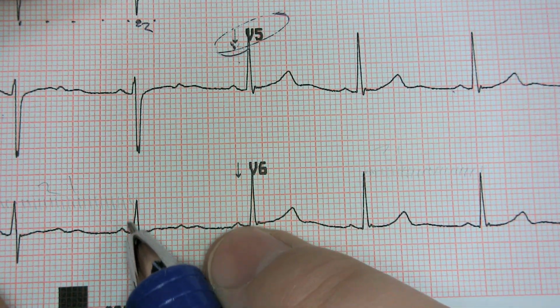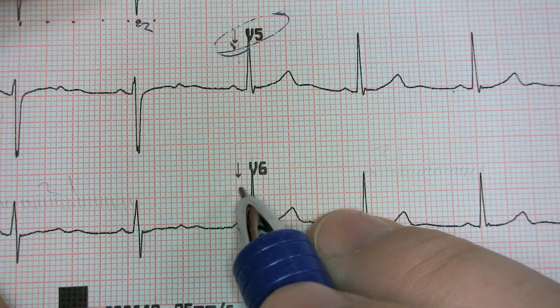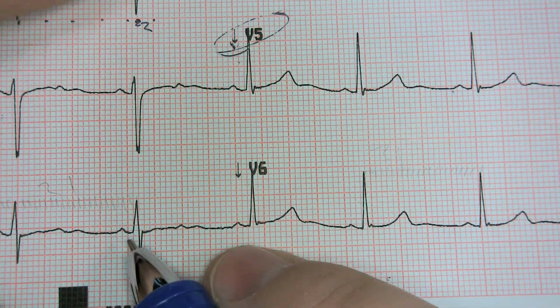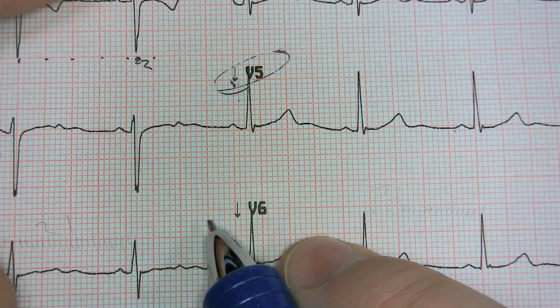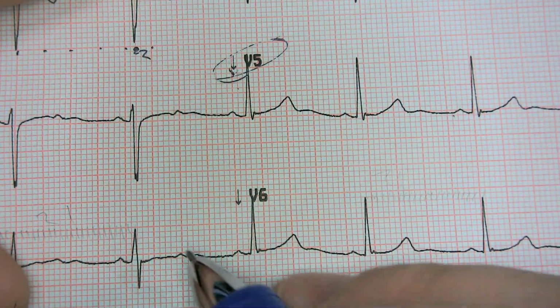This is less of a down, up. This looks more like an up, up. It's not perfect, but you know what? Of my 3 options, it looks like this is going to be as good as it's going to get. Does that make sense? All right.